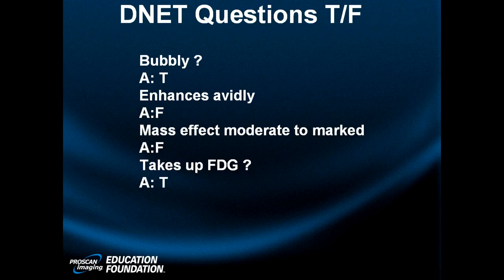Seizures are common with DNET. I'll stop right there. I have some questions for you that you can answer on MRI Online. DNET: temporal, more than peripheral, points to the ventricles, non-enhancing, doesn't calcify, no blood, no fat, a little bit of FLAIR signal around it, a little bit bubbly, may produce seizures, associated with dysplasias. DNET.